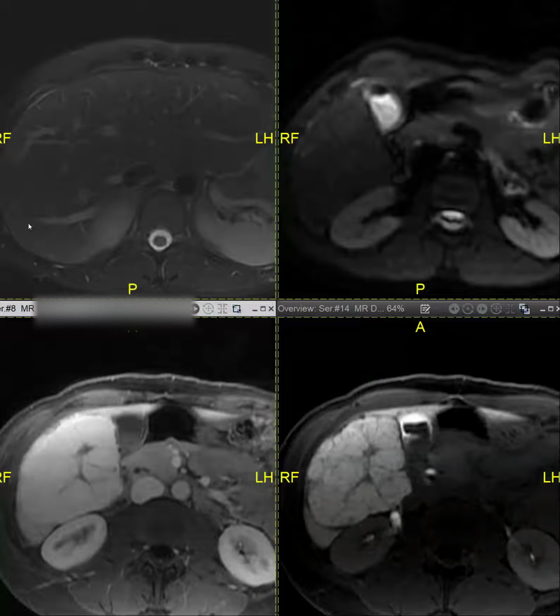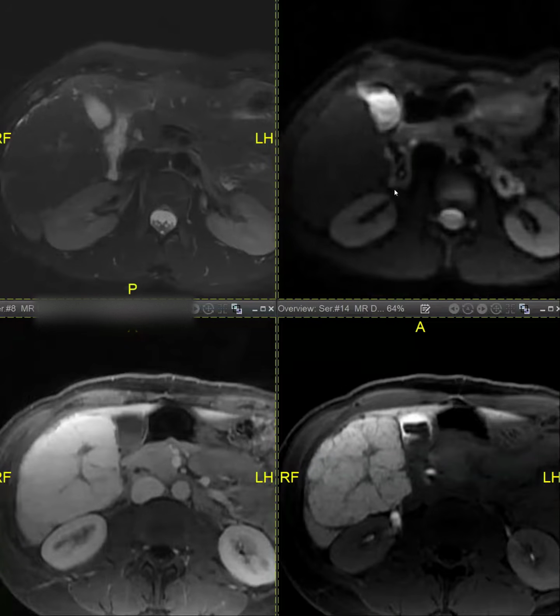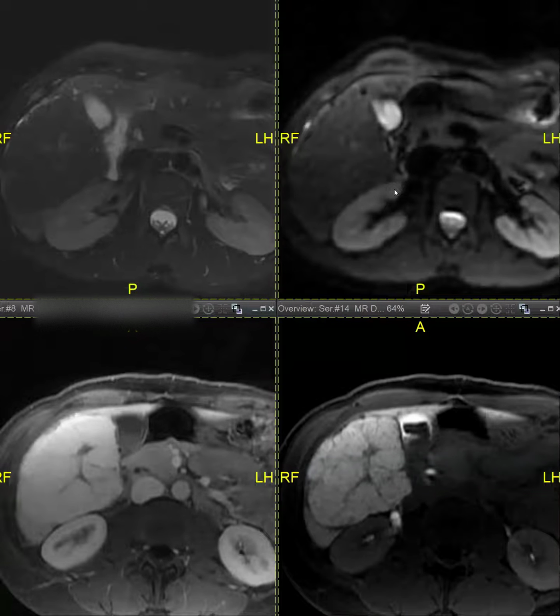I have a question. In the earlier case, you said something about 3% of adenomas retaining contrast, but I thought lately there are some papers coming out suggesting maybe even up to 20%. So that's the problem. When they talk about EOVIST retention, they don't talk about the pattern. I've seen papers where they show a huge, ugly beta-catenin adenoma, 10 centimeters, with one little patch that retains contrast, super heterogeneous, very different from this situation.